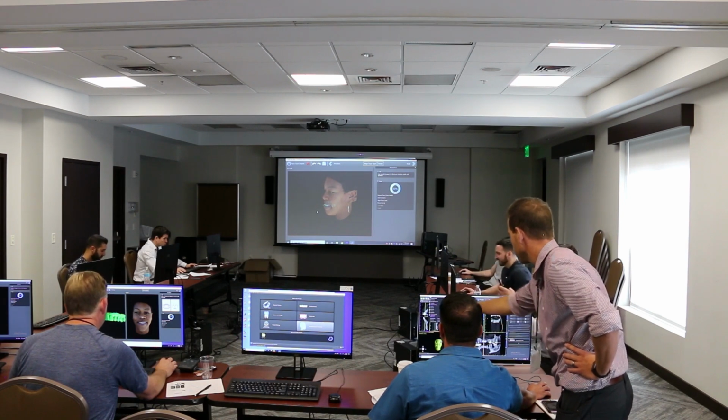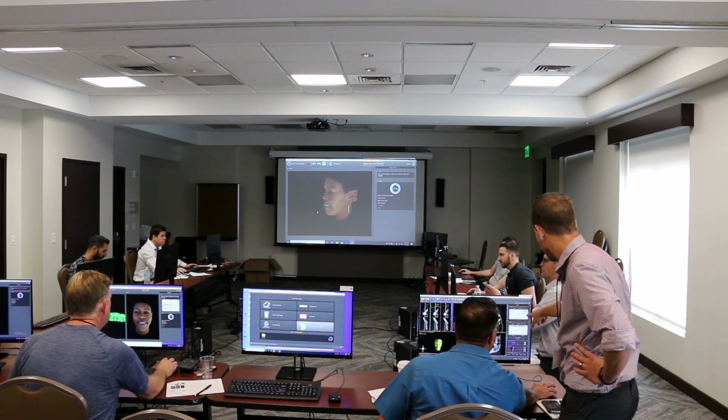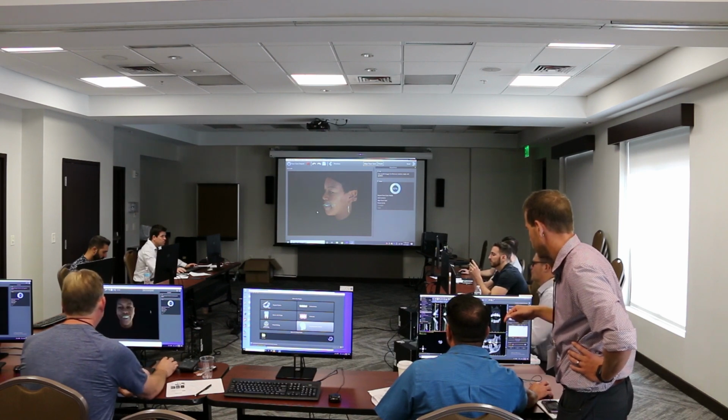And let's go to surfaces. That's it, and then hit the delete on the scan. This one there? Oh, and then let's go to file, and then import face scan.